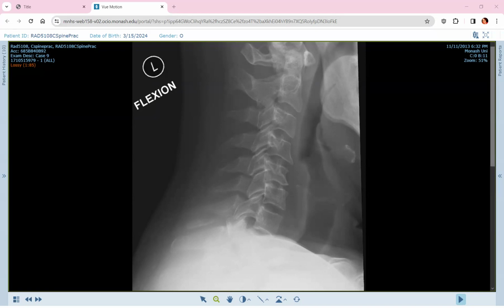These fractures are often caused by acute flexion of the neck when there is an excessive muscular load. This is probably something occupational with mine workers, where they do quite a lot of drilling, and there's quite an effect on the muscular load on the lower cervical spine. So we have here an avulsion fracture of the C7 spinous process, which is in keeping with a clay shoveler's fracture.